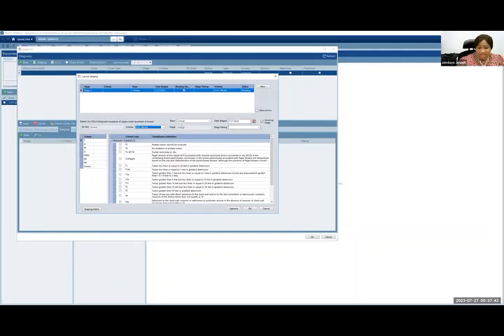And then this column is going to automatically complete itself when you fill in all the parameters. And the stage timing is what we're doing here. So is this pre-chemotherapy, post-chemotherapy, pre-surgery, post-surgery, pre-radiation? Most of the patients we see for breast are coming for post-mastectomy radiation. So you can say that this is post-surgery, or you can say that it is pre-radiation therapy.